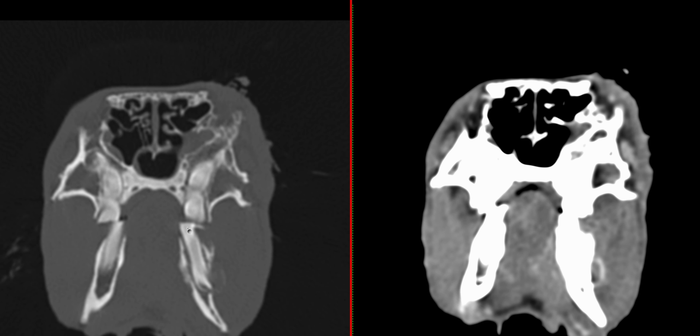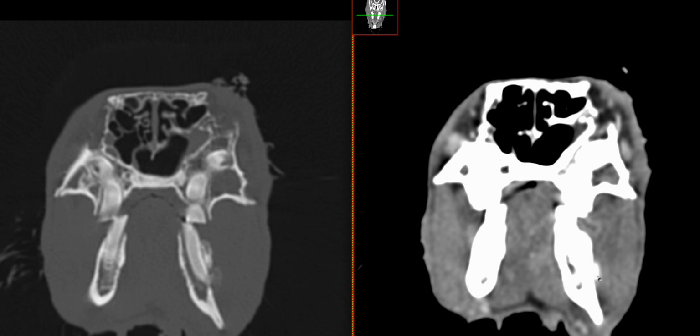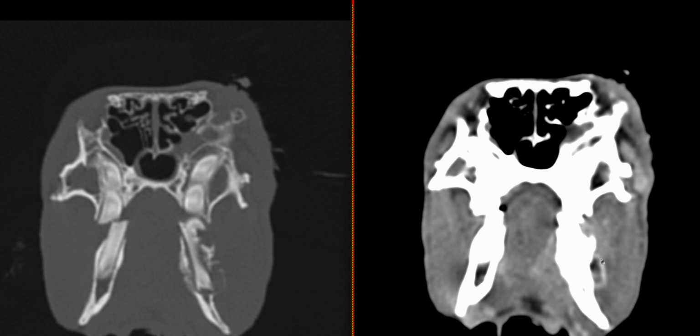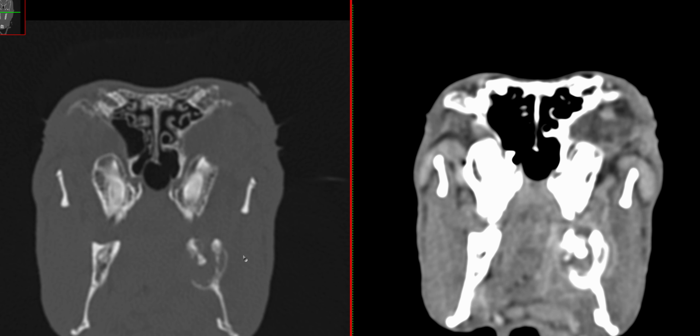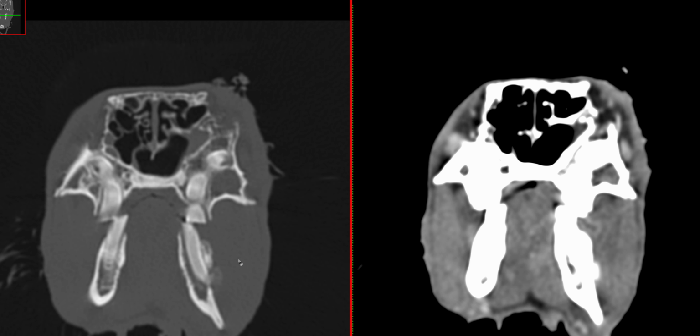it's a bit the opposite. So the tooth has a normal shape, but the reserve crown again has an abnormal orientation, and in this case is oriented laterally. And similarly, we have osteolysis of the mandibular bone at this level, especially if we compare with the contralateral, we can see the difference. And again, the soft tissue algorithm shows us that there is hyperattenuating material and there is a rim of contrast enhancement at this level. So this represents an infection, so an osteomyelitis of the mandibular bone at 2 levels.